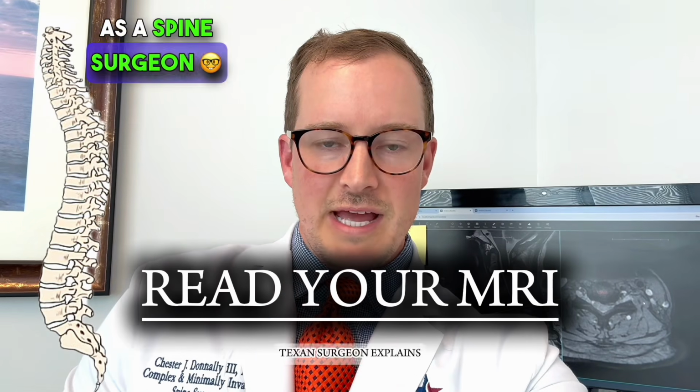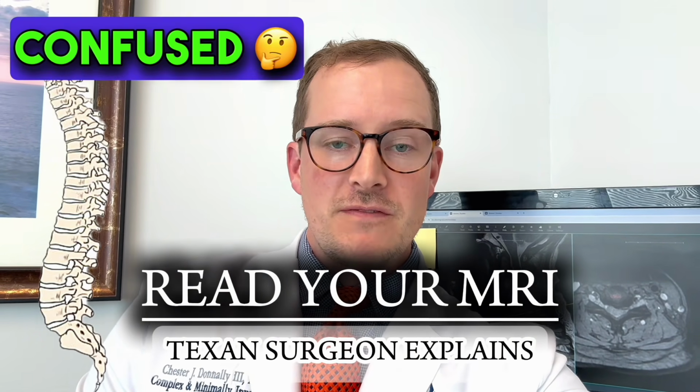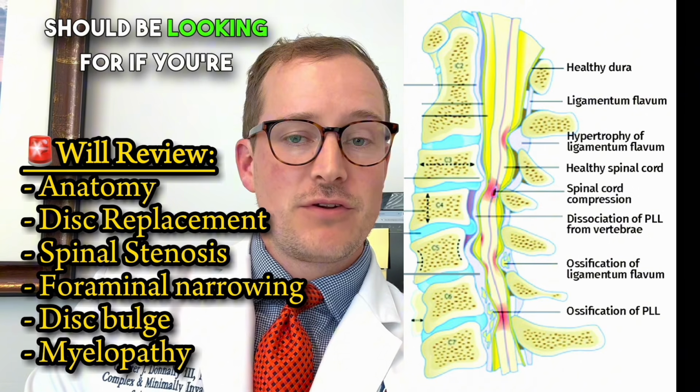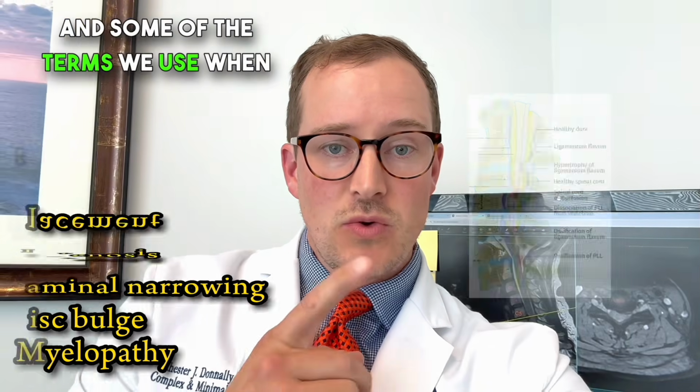As a spine surgeon, I see patients all the time who've looked at their MRI report and are very confused on what that means. Well, I'm going to go over a couple cervical spine details here to show you what you should be looking for if you're going to try to look at your own images and some of the terms we use when talking about a cervical MRI.